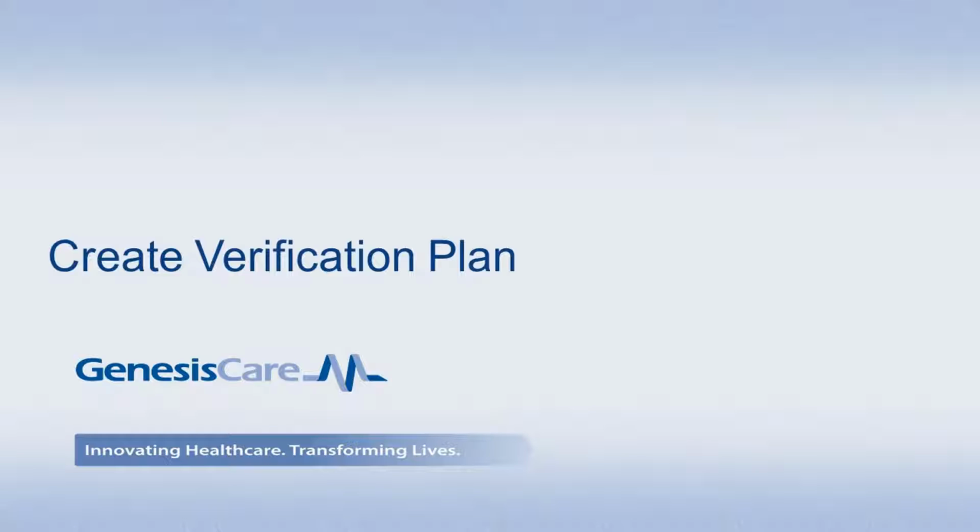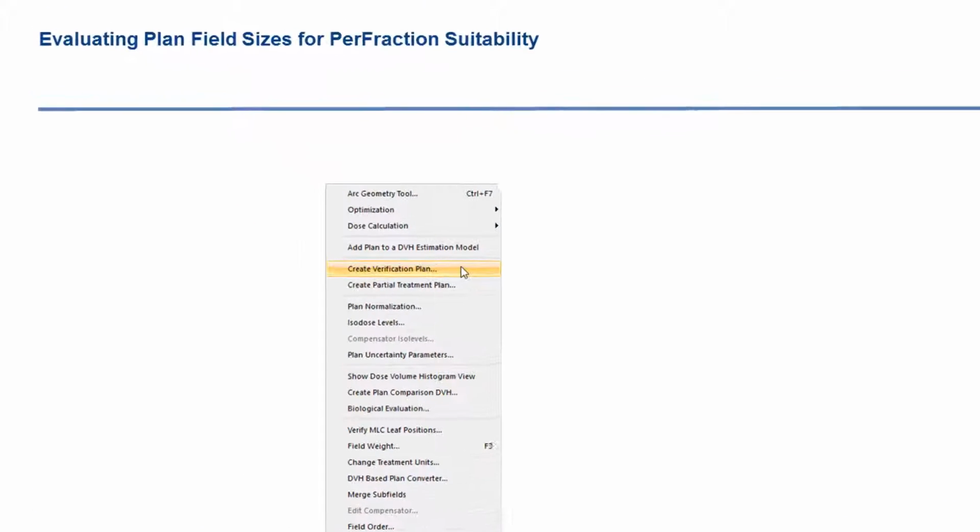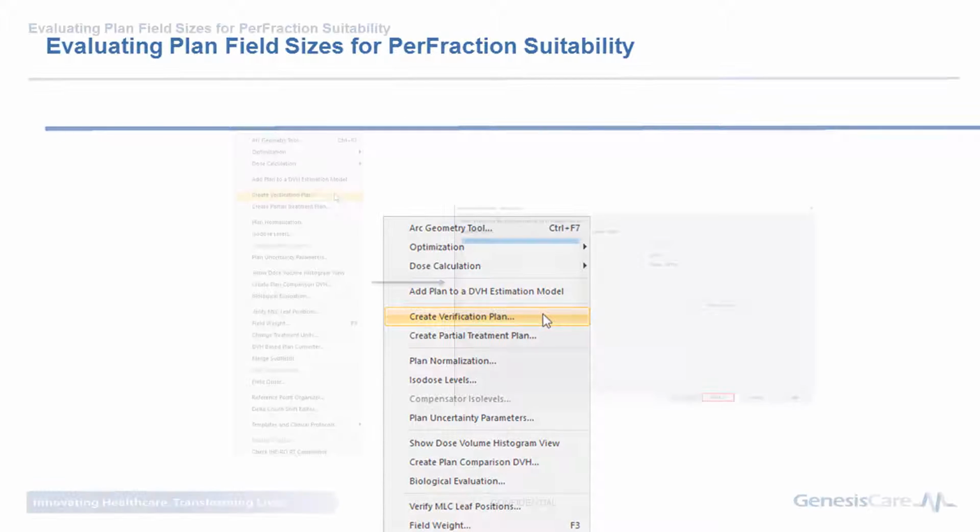To do this check, the patient's plan is exported to a verification patient with accompanying verification structure set. These structures show the size of each EPID specific to the linear accelerator type. To commence this process, select Create Verification Plan from the Planning drop-down menu and select the course.